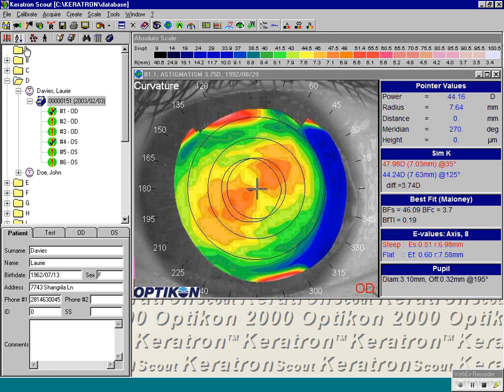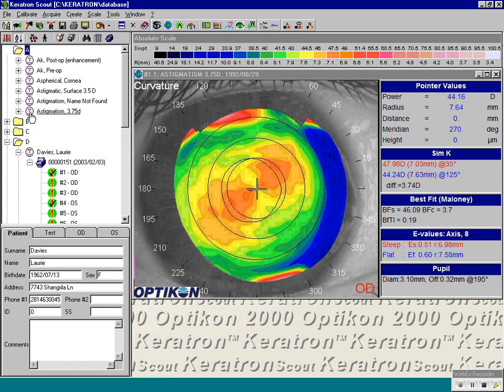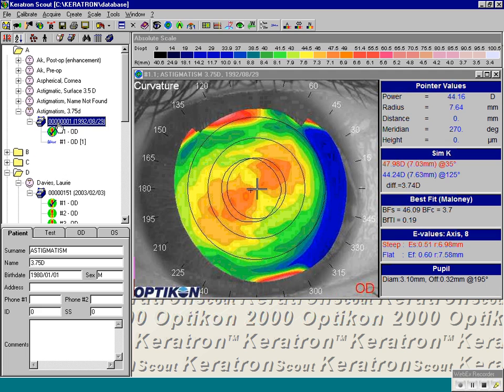The Database Explorer itself consists of the database containing all patient data. In the alphabetical order, file folders for patients who have been entered with initials such as A will be listed under A. Their names will be listed. Then underneath that would be a file box containing the data for that specific test. As you store images and subsequent tests for this patient, you would have additional file boxes in line.